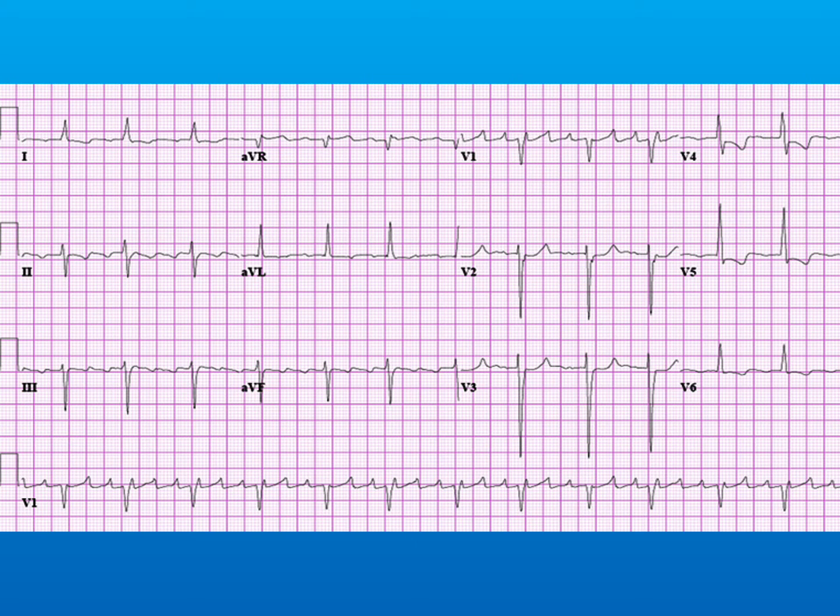When you calculate the QT, there's actually a shortcut to say quickly whether the QT is normal or not. If you look at the R2R interval, or if you take two QRS complexes, you identify the halfway mark. If the T wave ends before this mark, then we can assume that the QT interval is normal.